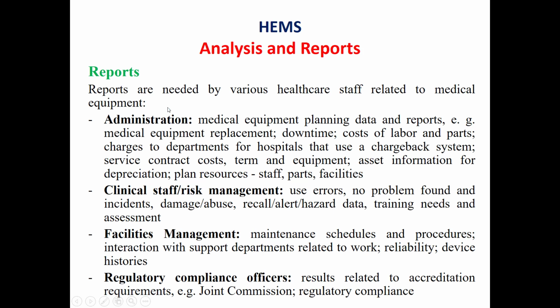We have different types of reports which will be used by different types of healthcare staff. For example, reports generated by the computerized maintenance management system will be related to the administration.